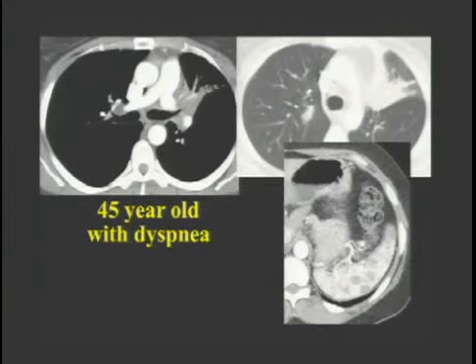This is a scan that was part of this same CT that extended down through the upper abdomen, and you can see a number of low attenuation lesions within the spleen. This has a differential diagnosis, of course, but one of the causes is sarcoid. This is a typical appearance for sarcoid involving the spleen. So in the differential diagnosis of this case, we suggested, well, it could be lung cancer with splenic mets, or it could be lymphoma, or it could be sarcoid.